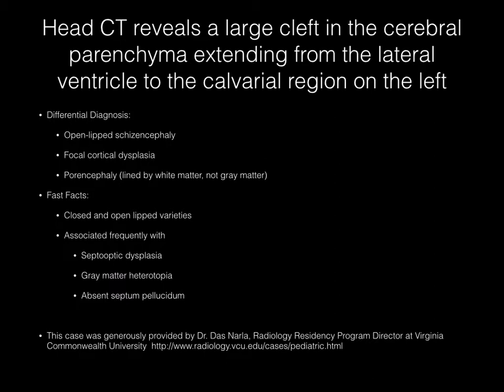This non-contrast axial CT image demonstrates a large cleft in the cerebral parenchyma extending from the lateral ventricle to the calvarial region on the left. The differential diagnosis here should include open lip schizencephaly, focal cortical dysplasia, and porencephaly, although this should be lined by white matter, not gray matter.